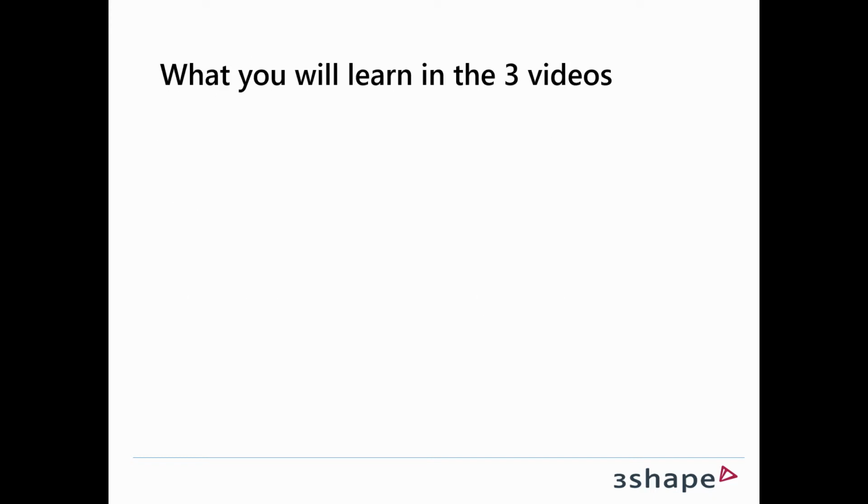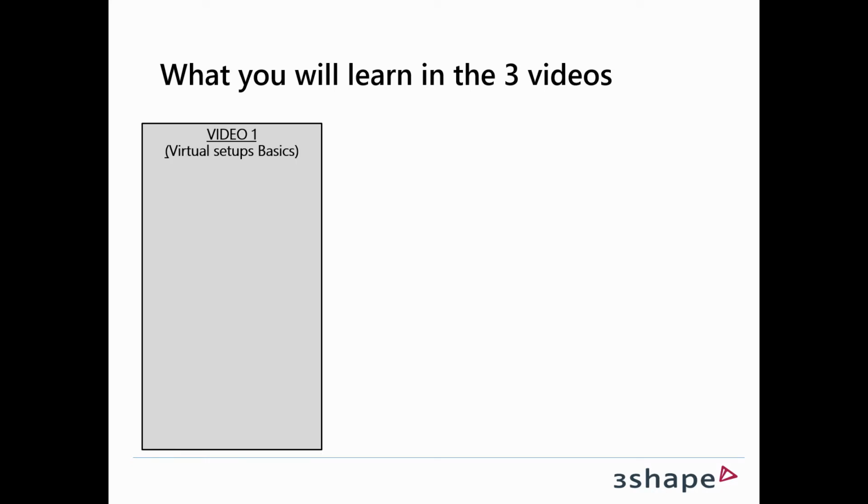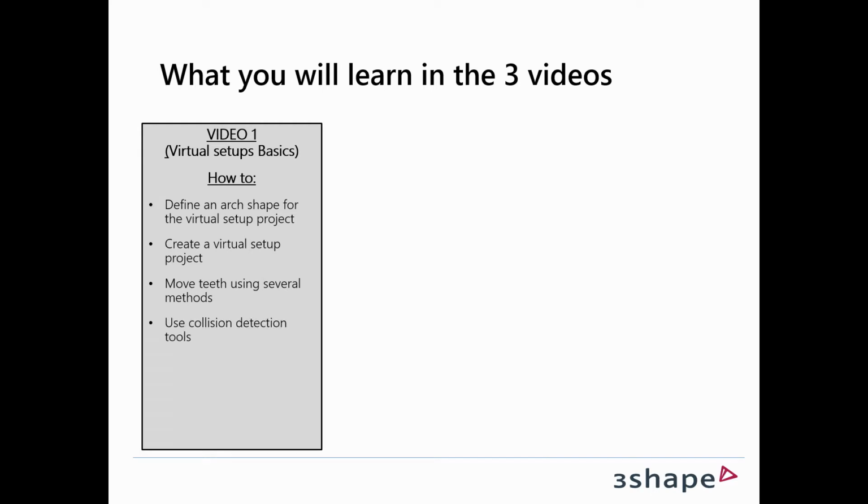So what you'll learn in the 3 videos: the first video, which is this video, will basically tell you how to define an arch shape for the virtual setup project, how to create a virtual setup project, how to move teeth using several methods, how to use a collision detection tool, how to export a virtual setup model set for treatment monitoring, and finally how to export a video animation.